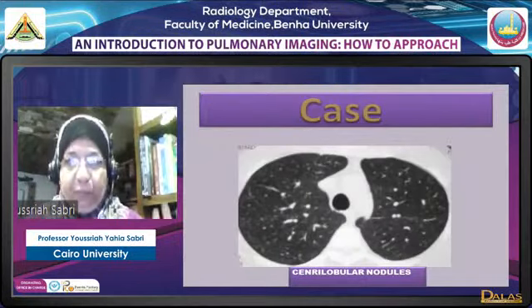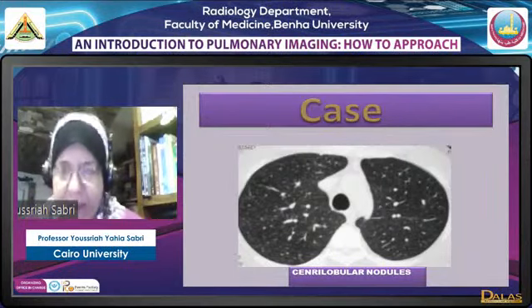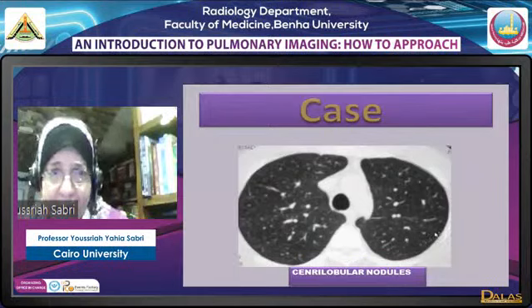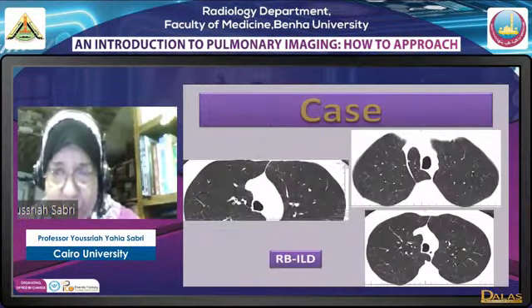Now let's proceed. Let us introduce you to nodules. Now this is a pattern of centrilobular nodules. This is how centrilobular nodules may look, as if we are dealing with stars at night in the sky. Another case with centrilobular nodules.